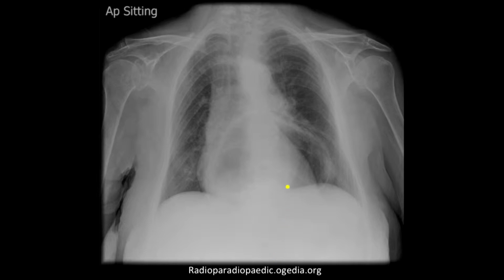In this patient, we're looking at the cardiac silhouette, and you can see that it looks enlarged, but we've also got this additional structure that appears to be filled with gas projecting behind the heart, and this is a large hiatal hernia. Often you can see fluid levels within these, but this is a very large gastric hernia.